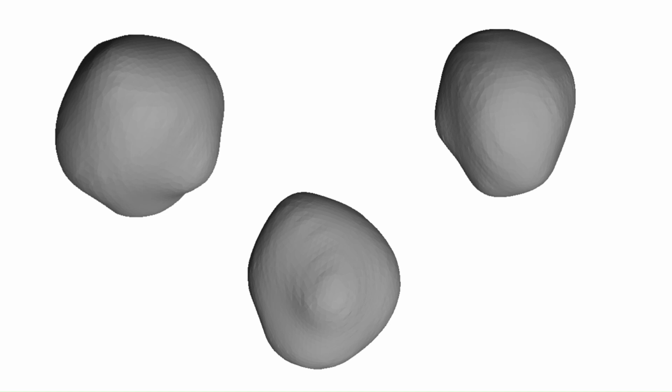These are some screenshots of brain tumor models from Slicer 3D. Okay, why are 3D models of brain tumor important? These play a very important role for surgeons who perform surgeries. So this acts like a data visualization technique so that surgeons can understand how the tumor is and where it is, particularly in the brain.